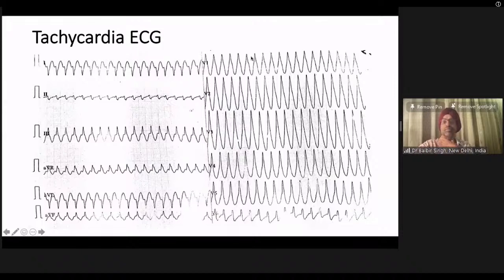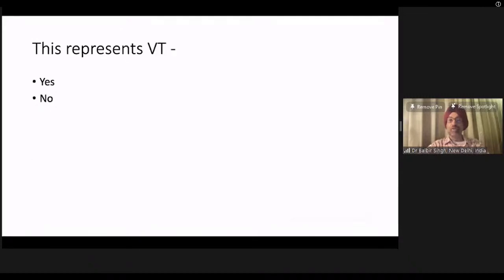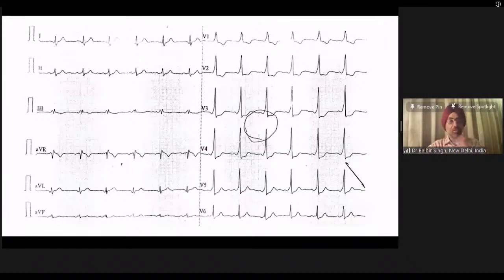Yeah, this is an important ECG. In these situations, adenosine sometimes can make things worse by causing the atrium to go into atrial fibrillation. In this situation, when the patient is stable, it would be better to give a class 3 drug or cardiovert this patient in the emergency room. Well, so this patient was cardioverted in the emergency room, and this is the ECG after cardioversion.